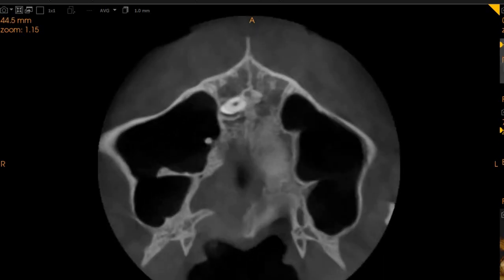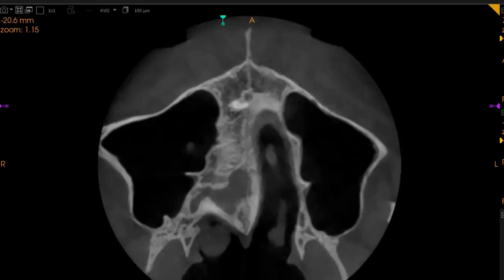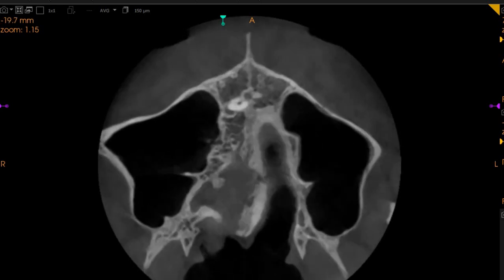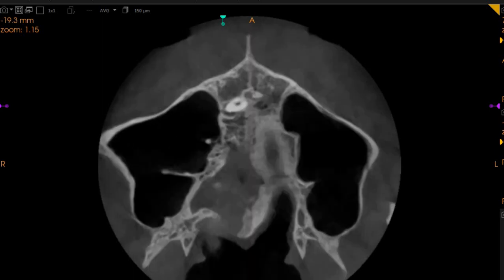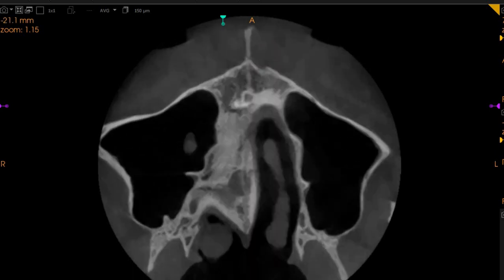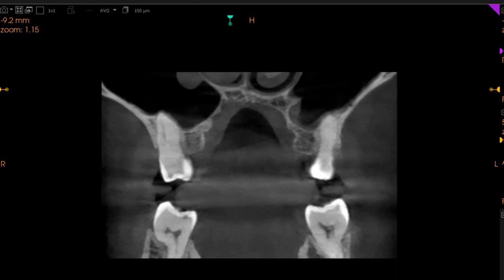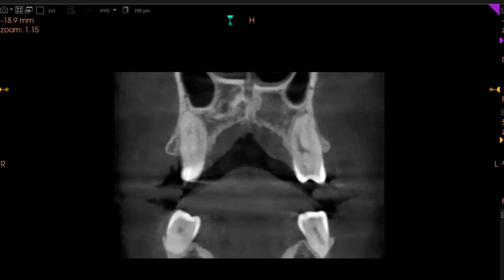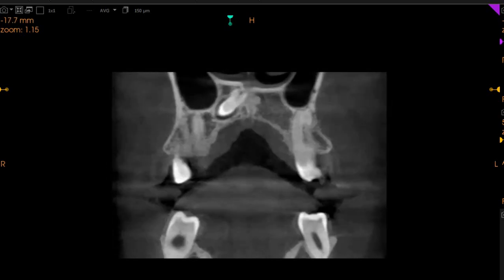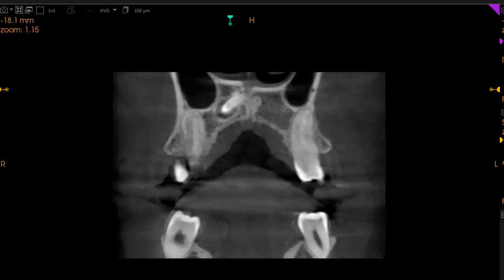One second. So if you notice on this view right here, my apologies, it's the same tooth which is crossing the incisive foramen, which seems like it is on the left side as well, but it's just one tooth, as you can very clearly see in this segment right here. And then when you move right here, you will be able to see how this tooth goes from here, and there we go. So this is where it crosses the midline, where we felt it was a second tooth, but it's actually the same tooth which has its apex crossing the midline right there.